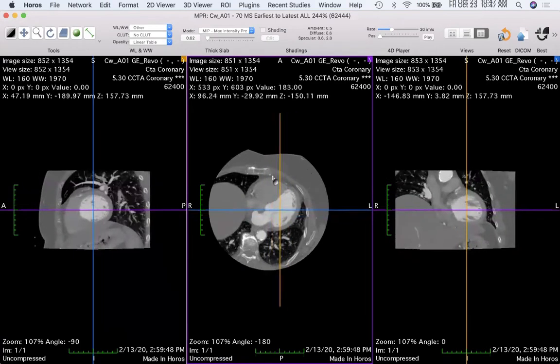And so I have the same axial slice, and the orange line tells me how I'm cutting the volume to look at this sagittal slice. So there's this little orange thing up there, tells you that's the orange slice. And then the horizontal line is the coronal, which shows me this view. So that's just like slicing the top off and looking at it that way.